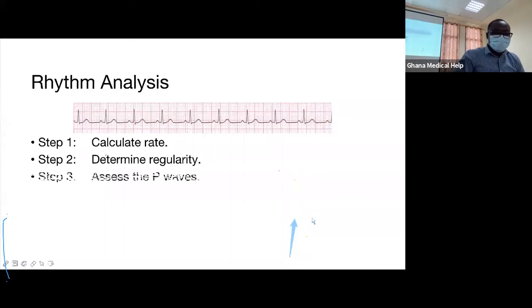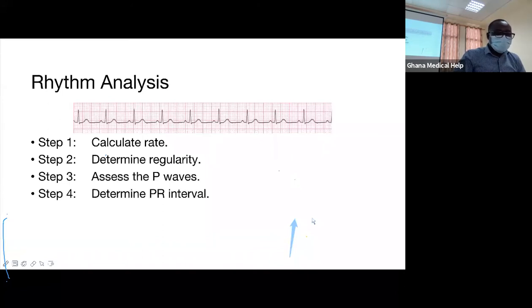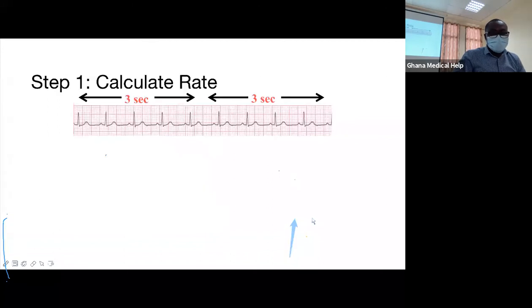We are going to look at that. We'll look at the regularity of it. We'll assess the P waves. We'll determine the PR interval. Then we'll look at the QRS.